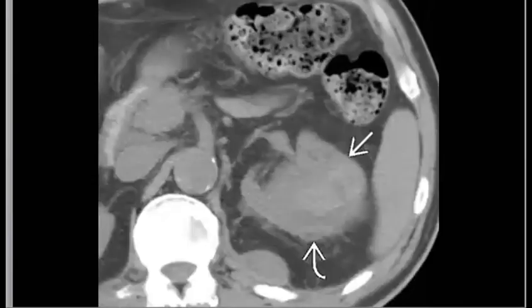So what happened here as a complication with RCC? Yes, hemorrhage. Why hemorrhage? Because we are in this phase, which is non-contrast. So if you compare this non-contrast with the appearance of this hyperdensity, it has inside a high density, which means that maybe there is hemorrhage. Okay.